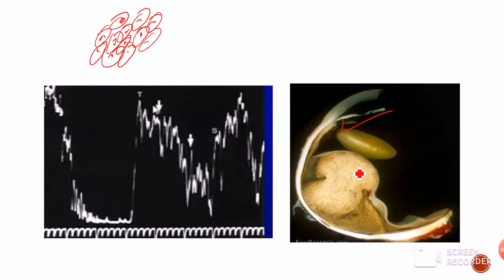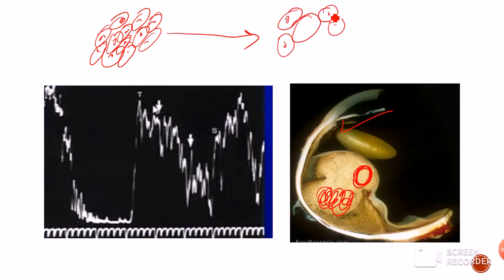However, in the same melanoma, if there is necrosis in some part, or if there is cystic changes in some part, what happens is that this homogeneous structure is being converted into a heterogeneous structure with variable density, right? So now the internal consistency is changing, and whenever the internal consistency changes, we are going to get different types of spikes, and usually we get very tall spikes, right?